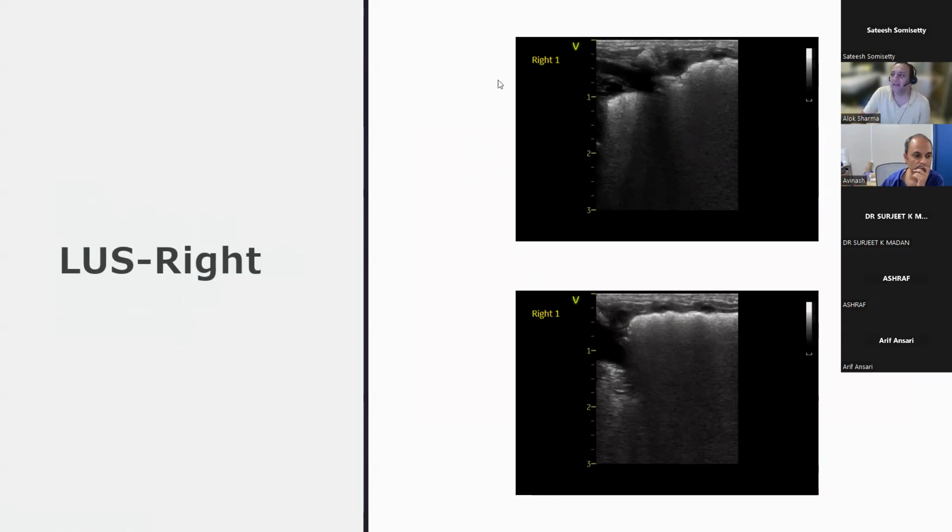But the other part of that R1, I think pleural sliding was there. Lung sliding was there, because when you have a right mainstem bronchus intubation, you lose your right upper lobe, but actually the mid lobe might be preserved in some situations. We've had a case which I'll share with you later on. That's a case for a different time.